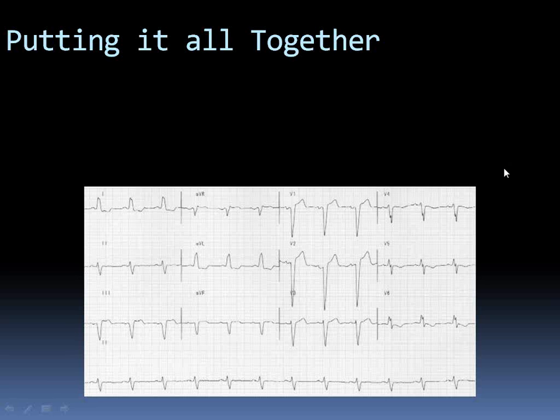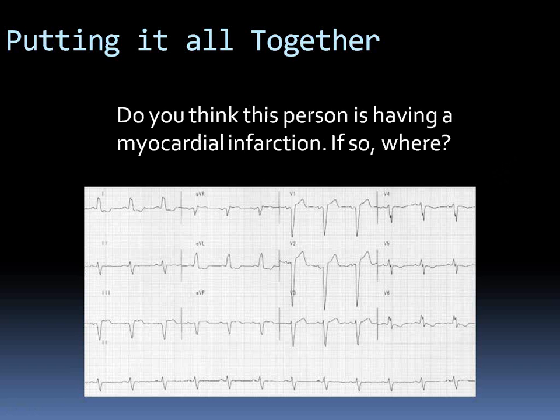All right. This is the first ECG that I've gotten for you guys. Just look at this ECG closely and tell me if you think that this person is having a myocardial infarction, and if so, where do you think he's having it? Which leads do you think show ST elevation over here?